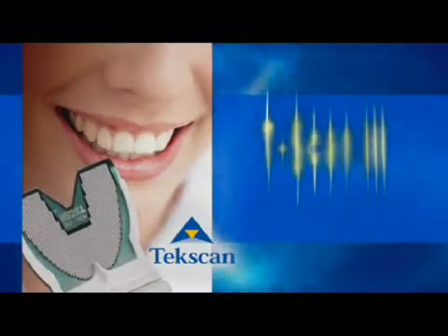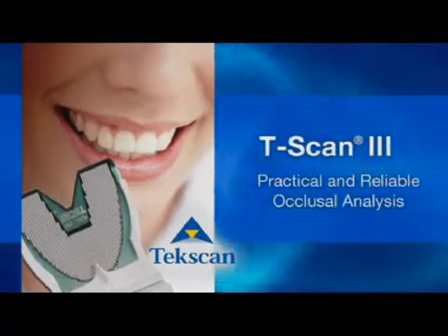Computerized occlusal analysis gives you the control to refine occlusion. The concepts of bilateral simultaneity and immediate posterior disclusion are important and have been around for a long, long time. With the T-scan, you have an instrument that can measure these concepts for improved diagnostic data and more accurate and reliable occlusal treatment. The T-scan measures relative occlusal force and both the occlusion time and the disclusion time.